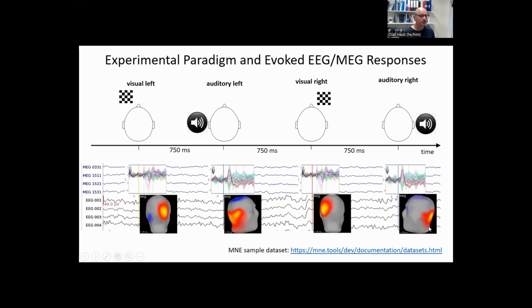But it just illustrates that looking at the data across the scalp or at the surface or in sensor space can be misleading unless you really know what you are doing. So that's why ideally, of course, we want to find ways of estimating what's going on inside the brain and do source estimation. And that is one part of the following lectures that's going to deal with that.